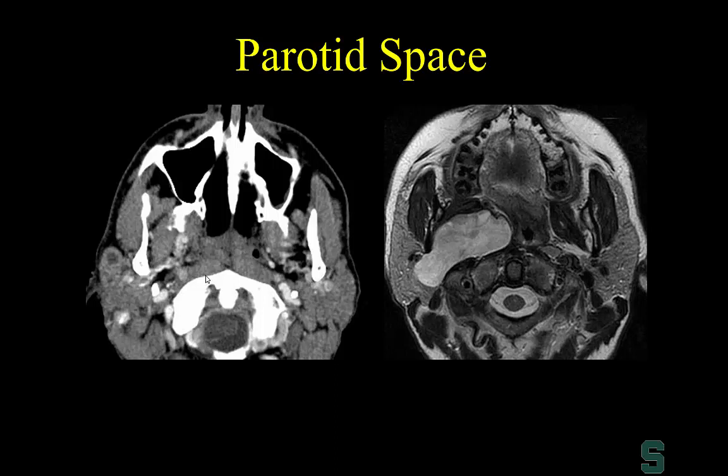So this is just an example of lesions, in this case involving the superficial lobe. So here's the mass involving the superficial lobe of the parotid gland. Here's the retromandibular vein. So our facial nerve is about at the tip of the arrow. But in this particular case, we can see this mass is deep to the retromandibular vein, deep to the facial nerve, and extends deeply to involve the parapharyngeal space. So if you will, this is where, again, we earn our value, because we can then help direct the surgical management. Because if we do say the mass is involved in the deep lobe, then these patients have to undergo a total parotidectomy, where if it was isolated just to the superficial lobe, then they can just undergo a superficial parotidectomy.